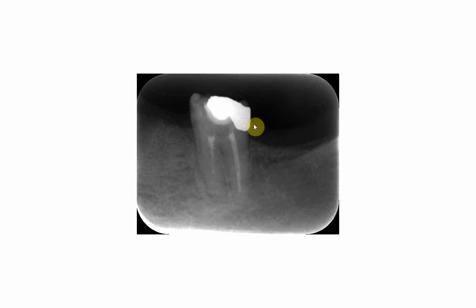And you can see the amalgam filling over here, the DO filling. This is the occlusal part and this is the distal part of the filling. It appears quite radio opaque. Compare it to the radio opacity of zinc phosphate cement. You can see the radio opacity is much less, but you can still see it, and it's apparent that the two materials differ in their radio opacity.